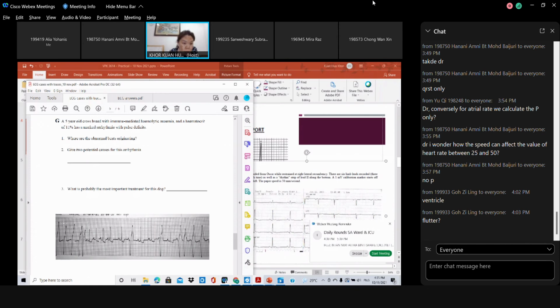So let's say we start here. 30 boxes, a bit too much, never mind. 2, 3, 4, 5, 6, 7, 8, 9, 10, 11, 12, 13, 14, 15, 16, 17, 18, 19, 20, 22, 24, 26, 28, and 30.